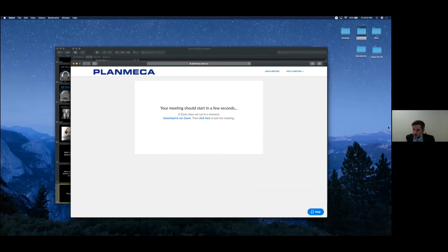Someone asked, would you want to check the coronal view also to make sure that it is actually attached to the tooth? I'm not sure which example that was referring to, but whenever I see something, I want to look at it in all three views. The person that asked that is spot on. I just showed the examples tonight in one slice because of time. But yes, if you see sclerosis or an opacity, I'd want to check all three views.